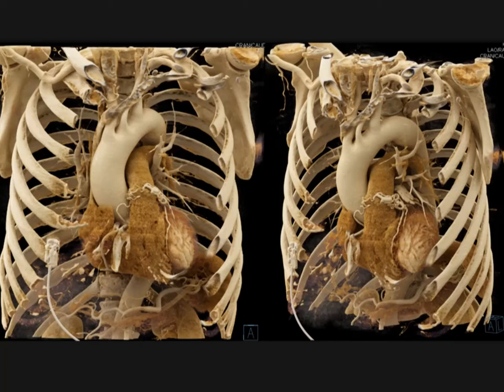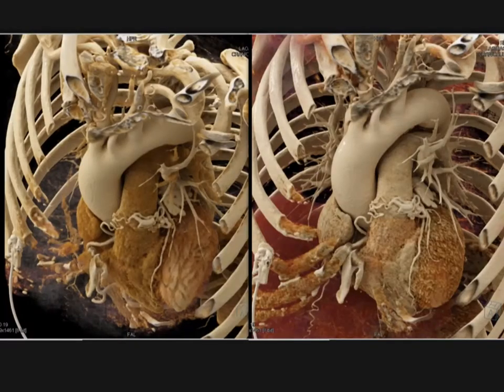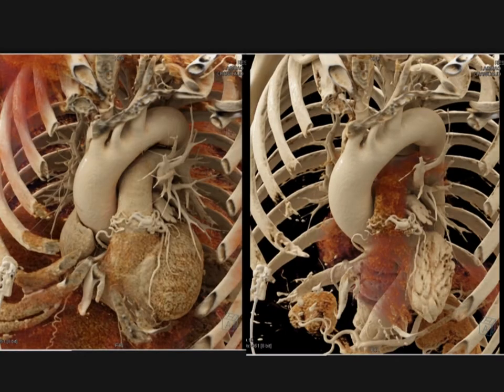You can see, look at the aorta and the branch vessels off the arch, how sharp and shiny it looks. Again, it's almost too nice, but you get a feel of how I can adjust the parameters. You see the difference between the density of the pulmonary artery and the aorta. You see the coronary vessels very nicely shown there and here as well. So the ability to visualize even small vessels, many of those little vessels off the coronary artery fistula are just a few millimeters in size, yet look how nicely you can see them.